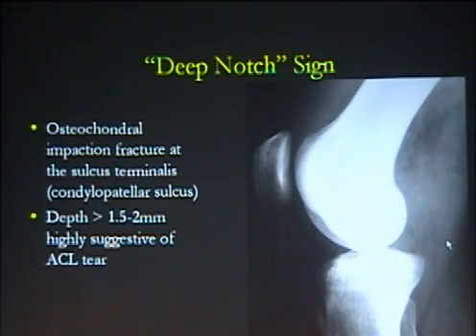I love this sign. I think it's a great sign. It's great to torture the residents with because they never pay attention to it. But this is a great sign. I think maybe you see it more than the Segond fracture. It's a great sign of ACL tear on plain film.